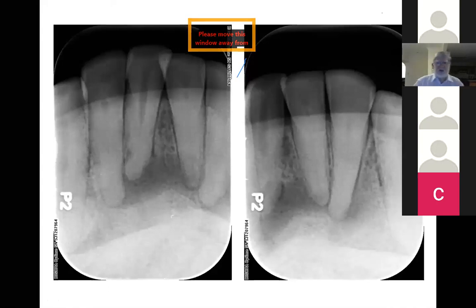Also, relatively recent case, patient came in a lot of pain. So he's had this from trauma. You can see the lesions occluding. That area started to occlude, that's occluding, that's occluding. We can probably see intact lamina dura there. We can still see it there. We've lost it on that too.